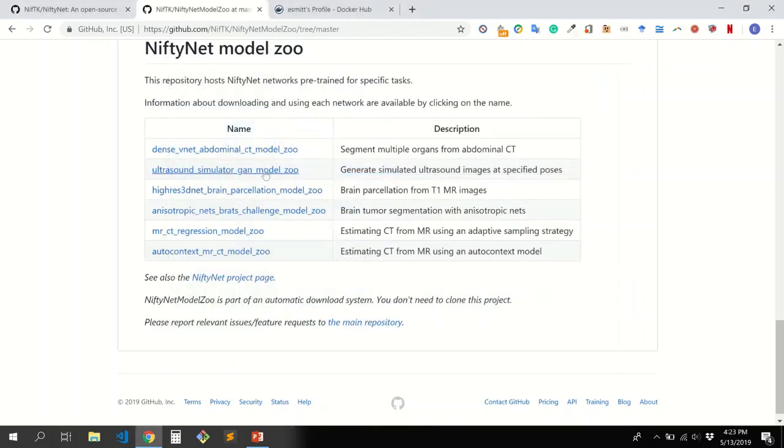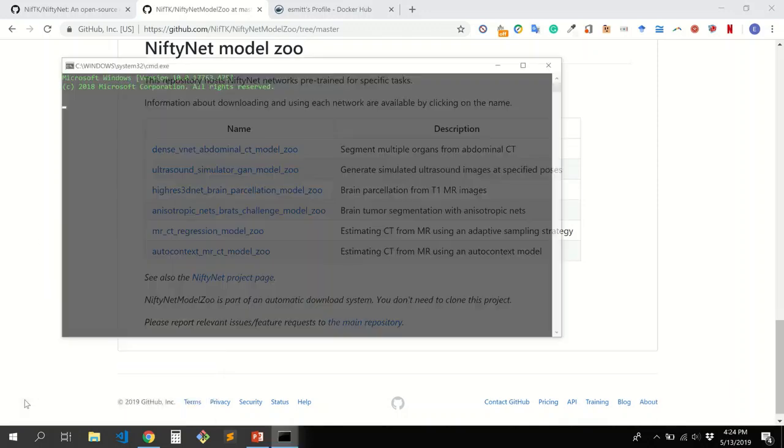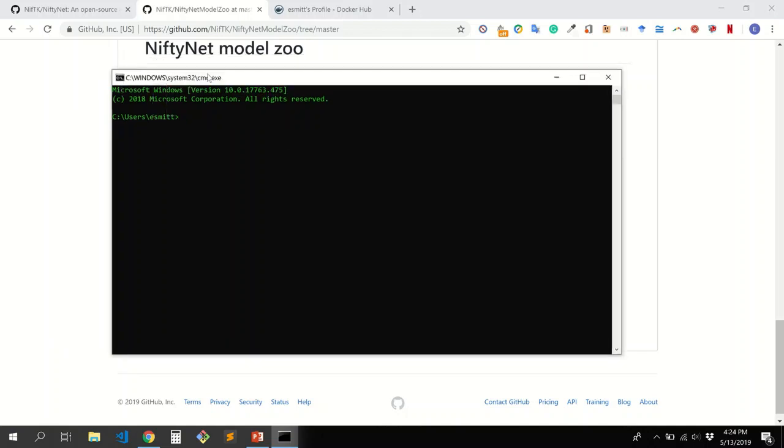After this, we can use Docker. It's important that Docker is running. You can use PowerShell or the classic command console. I use the command console because I like it more than PowerShell. This is the console. So first we can check how many images we have installed.